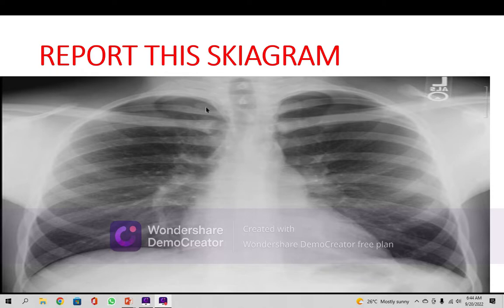Then afterwards, you have done all this routine protocol. The conclusion is that this patient has been suffering from a bony deformity. Because of the bony deformity, we cannot comment on the trachea, we cannot comment on the cardiac size, rather the pulmonary conus is visible and prominent, and these are the positive findings. Conclusion means positive findings. Our conclusion is this, our inference is this.